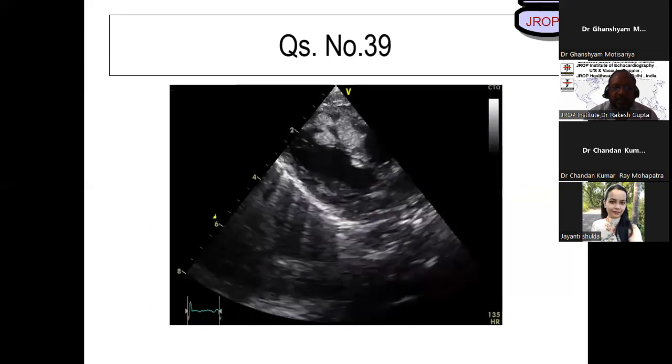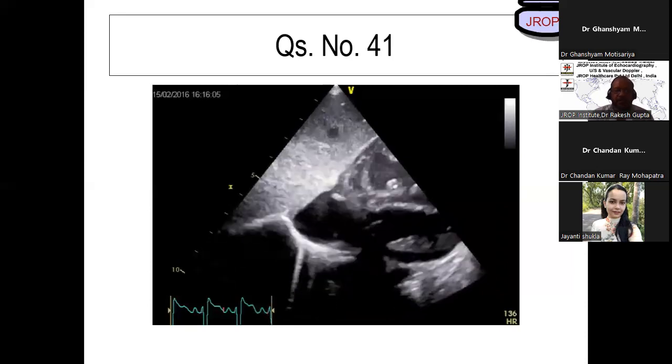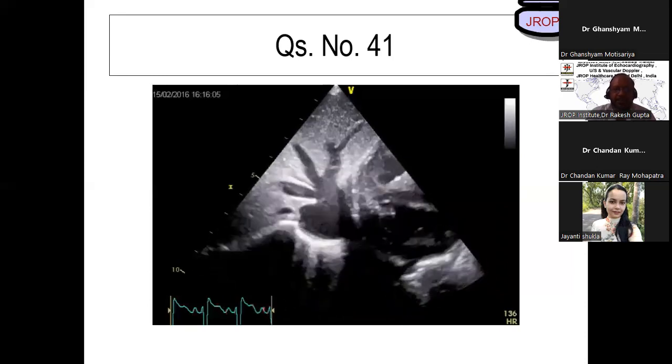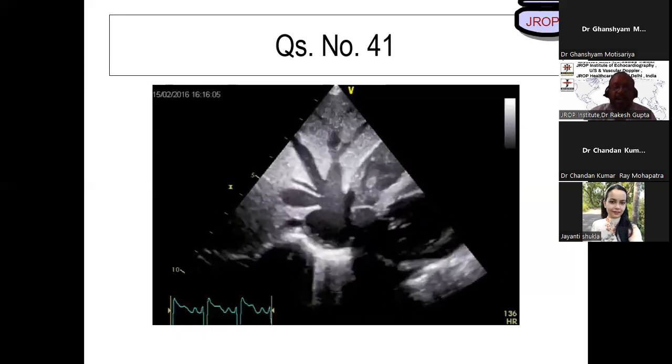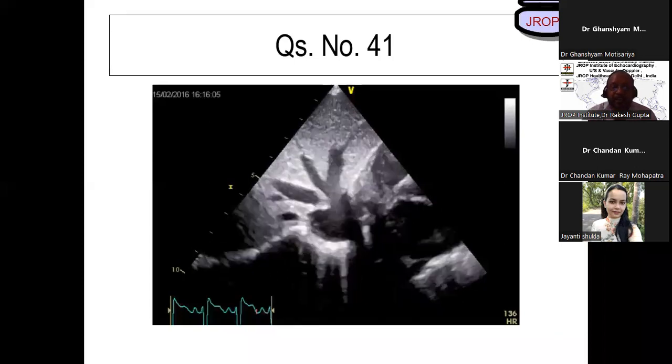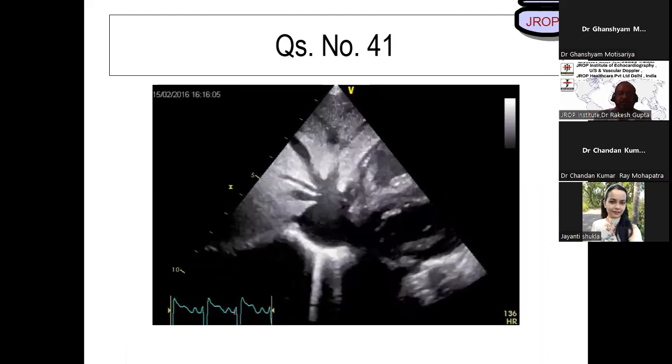What is the IVC? Good, bad, or beautiful? Not dilated. Look, this IVC is hugely dilated. And what's the importance of this? These are all hepatic veins which are seen over here. All the hepatic veins are dilated and the IVC is also dilated. If you happen to see this kind of dilated hepatic veins and dilated IVC, what is your possible diagnosis?